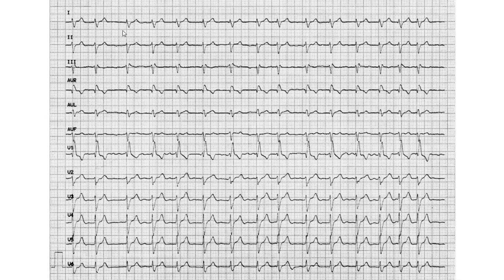Point 2, P waves. No, I don't think I see P waves. These are all T waves, T waves, T waves. I don't see any P waves. In V1, I see multiple P waves. That's not multiple, that's fibrillation.